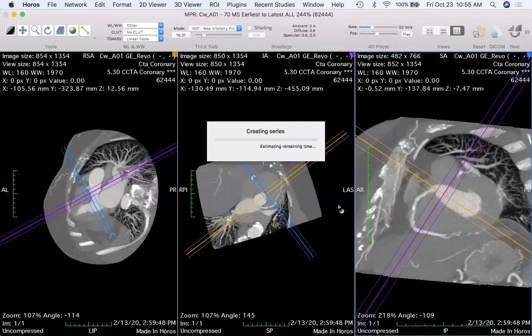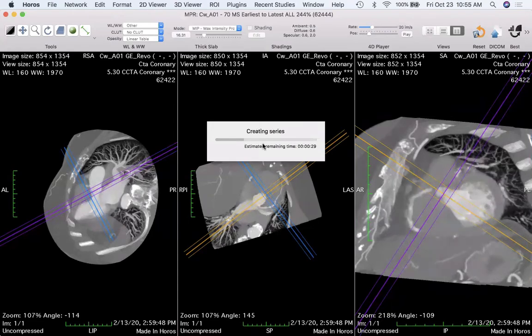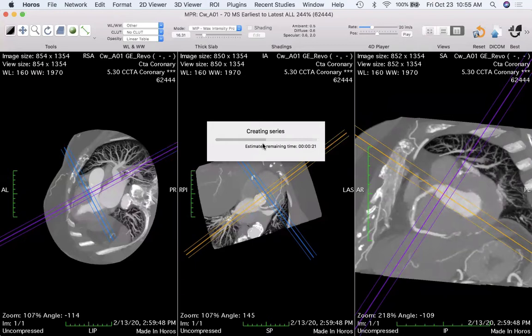And now I think it says it's creating a new series, right? And it's producing those maximum intensity projections at each time point. And we can read that back in if you want to look at it at a later time. Okay? And you can also save those new DICOMs out to disk. And I can show you how to do that really quickly.